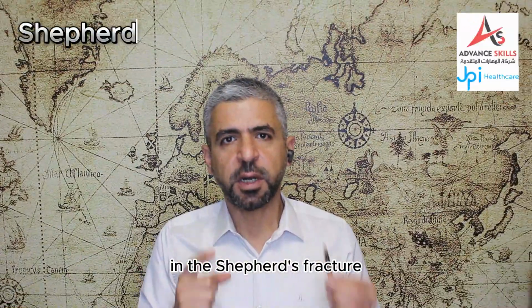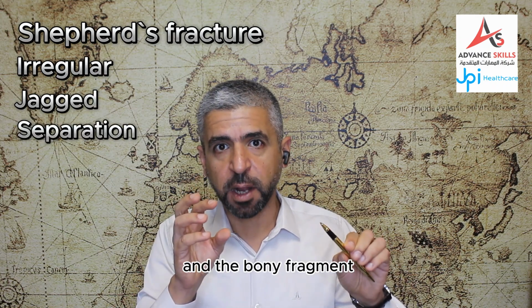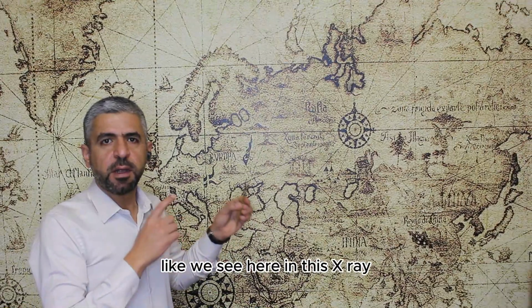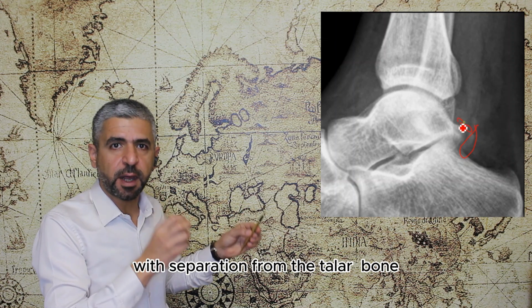In the Shepherd's fracture, there will be irregular jagged separation between talar body and the bony fragment. There will be progressive widening of the fracture site. Like we see here in this X-ray, you can see the fractured fragment with separation from the talar bone.